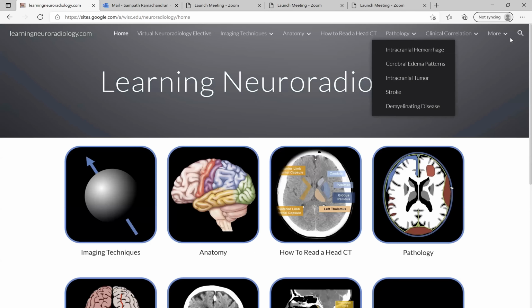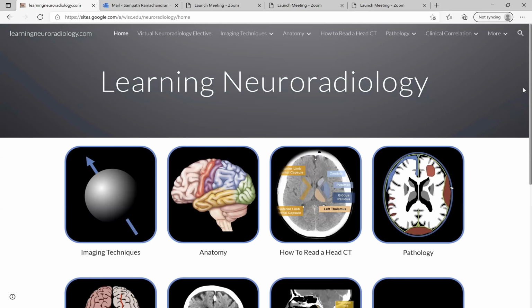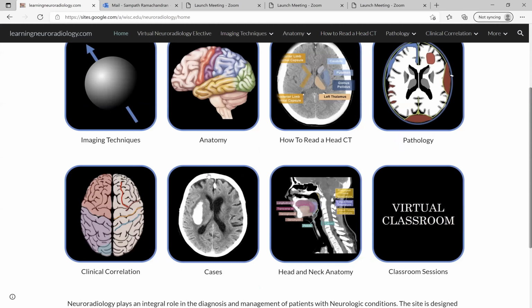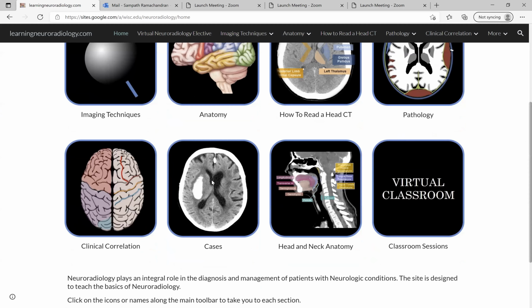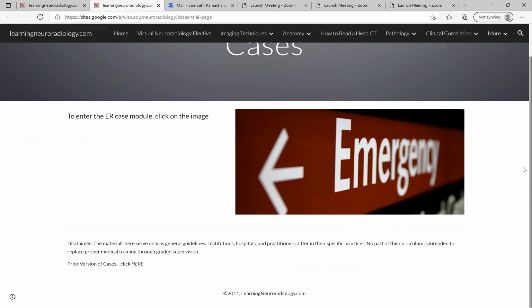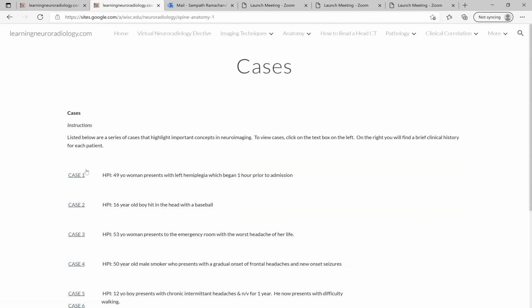So now I am going to present a bunch of cases, which is a good way to learn instead of going through the anatomy itself. I'm going to quickly switch over to some cases, and then I'll speak about them individually. That way you can understand what I'm speaking about in terms of the basic anatomy.